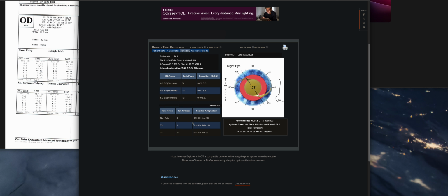So in this case, yeah, we go with the 5.5 diopter, first minus. Yeah, definitely want that one. Look at the first plus, it's 0.4, and there's nothing in between. Gosh, that's a 0.7 diopter jump there, for a 0.5 diopter lens power.